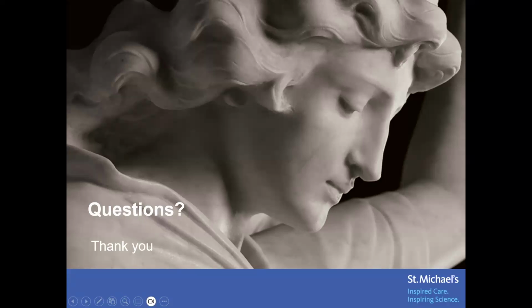So it's useful to know that for any bileaflet tilting discs that are commonly used in the last 15 years, there are 3 holes in each of these bileaflet tilting discs, and the central hole is the smallest one, would have the highest jet. The challenge is actually isolating them, because the flow goes right after. So when you put the CW through, basically you look through the whole line. It becomes almost impossible to tell one from the other. I don't know whether you're actually able to identify which hole comes from which in reality.